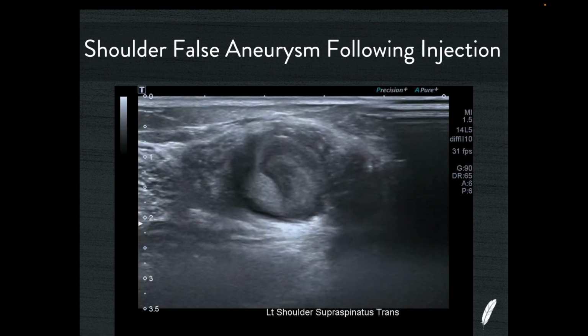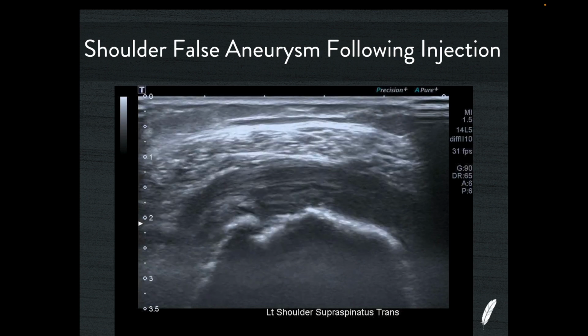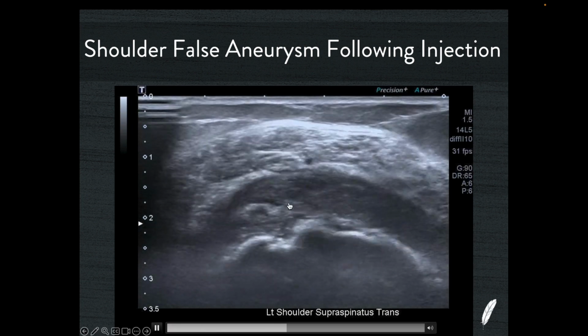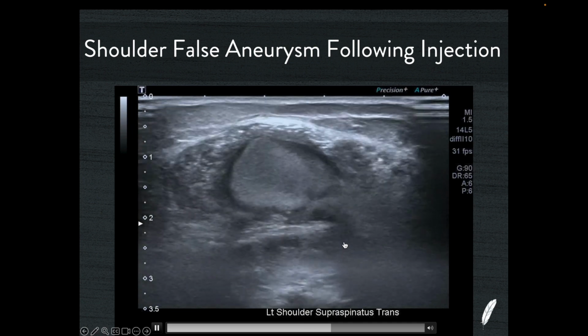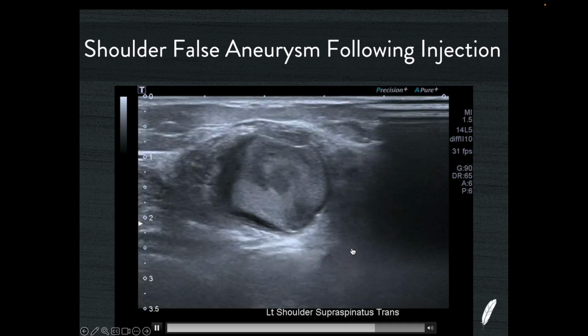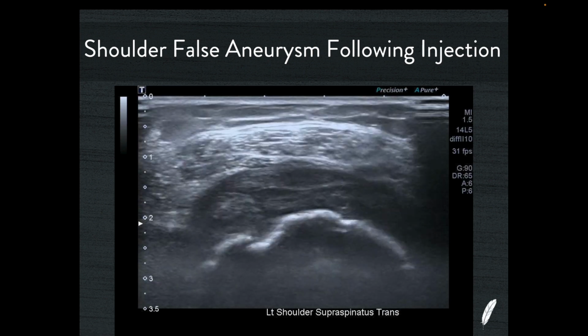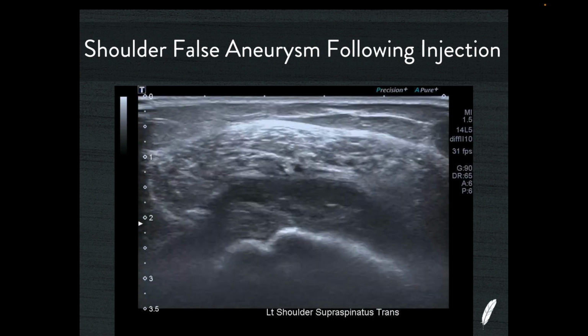So really what's been performed here is probably more of a joint injection, because this area that looks like it should be the rotator cuff is really just a bit of blood and other detritus sitting in the space where the rotator cuff would be. But nonetheless, the needle was placed in the usual location, and this would be a bursa/joint injection.